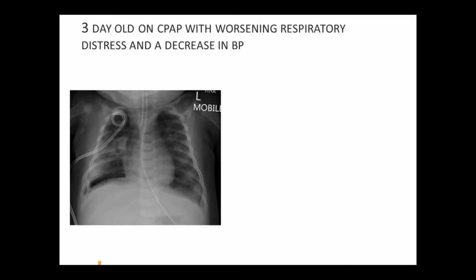Now, let's look at the lucency of the lungs. There seems to be an area of hyperlucency in the right upper lung, and there also seems to be a tube of sorts inserting into approximately the same region. There also seems to be a smaller area of hyperlucency in the right lower lung near the right hemidiaphragm. Aside from that, the chest X-ray looks pretty normal. What is your working diagnosis at this point?